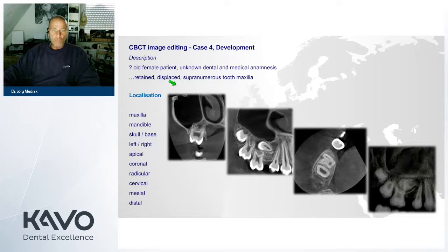And we see obviously that there is some kind of retained, displaced, or supranumerous tooth in the maxilla. But this is not the main indication. This is a side finding. So what we are talking about is in the maxilla. It's in the tooth-bearing area. And now we look at the teeth of this patient. Just look at the structure and the appearance of the teeth.